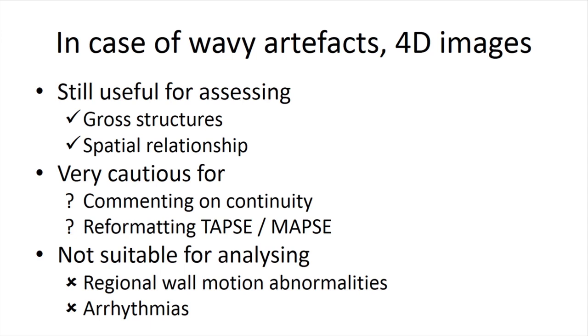I saw many articles over the past several years about TAPSE and MAPSE using 3D, so you have to be very careful. It's also not suitable for analyzing regional wall motion abnormality or for arrhythmia assessment.